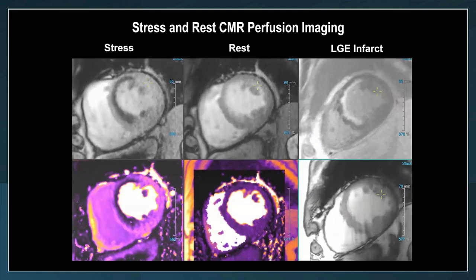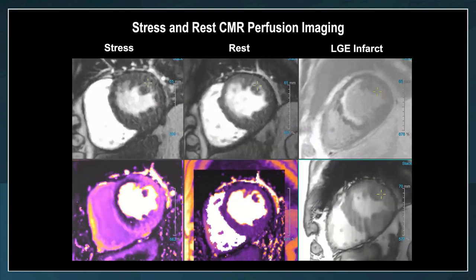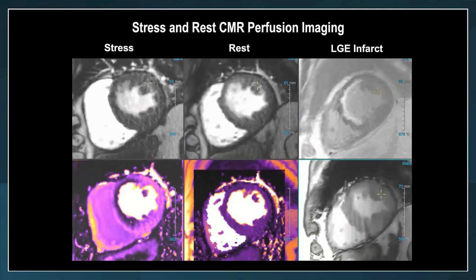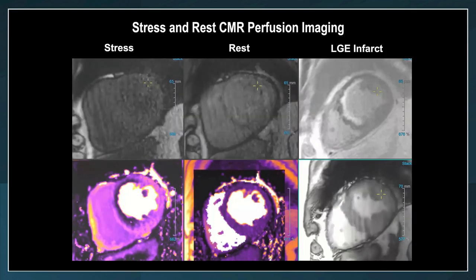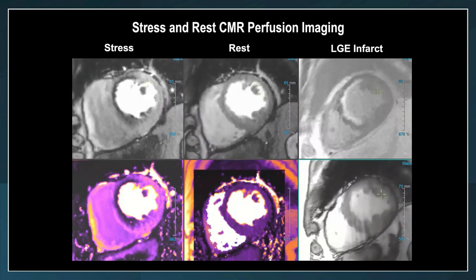These patients undergo the cardiac MRI perfusion imaging without any need for breath holding or post-processing, because the blood flow maps are generated automatically. This gentleman had a prior CTA recently and was noted to have moderate stenosis and was treated medically. He now came back with troponin elevation and recurrent chest pain.